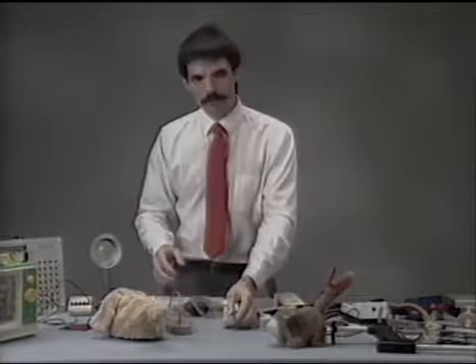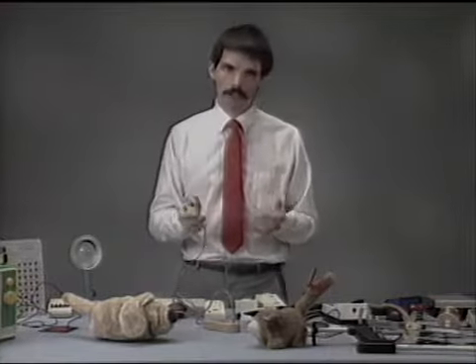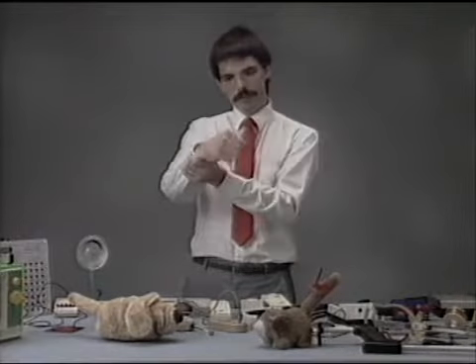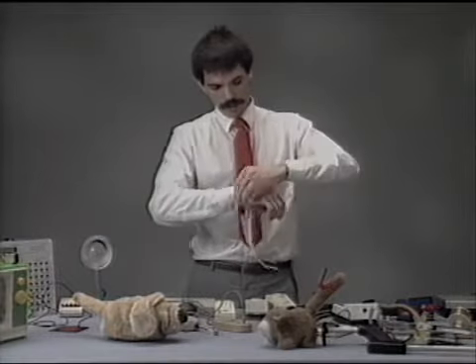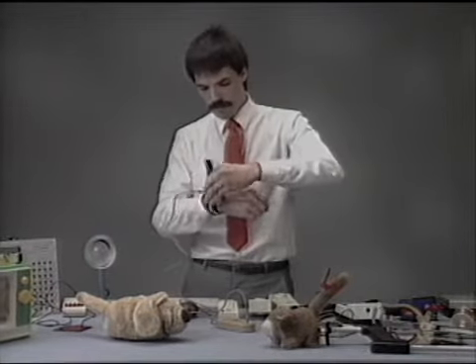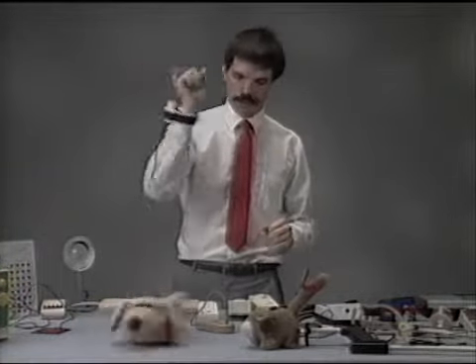Now, for some individuals, the activation of the switch like this can be done with a head movement, or it can be done with a leg movement or a knee movement or other types of movement of the body. But for other people who have good movement of maybe the wrist, but their arms are going all over the place, we can take this same switch and we can just strap it right onto your wrist here. And now I can move my arm freely and still activate the toy. I can be moving my arm all over the place and still turn the toy on and off.